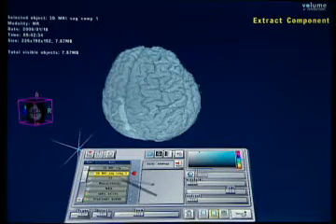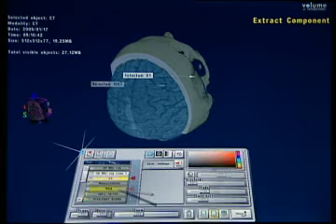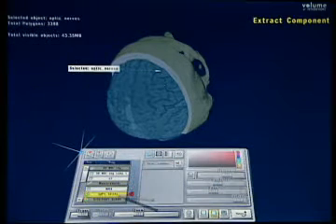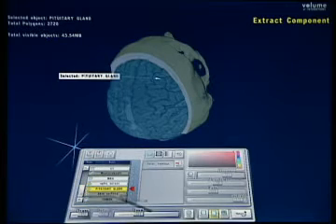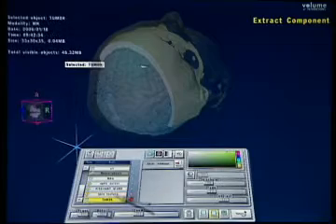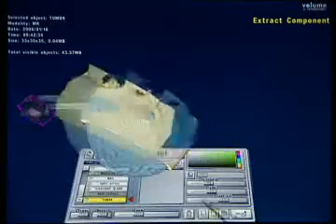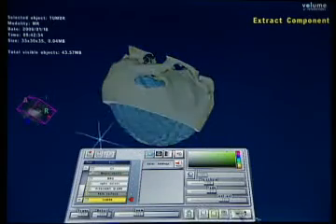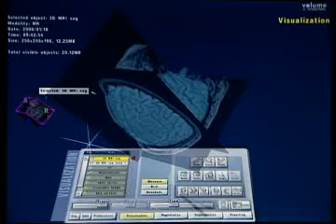Of course, immediately now I can put back the CT. I can put back my MRA, my optic nerves, and my pituitary gland. Even have a skin surface, you don't really need now. And the tumor. So again, here's my opening. Visualization.